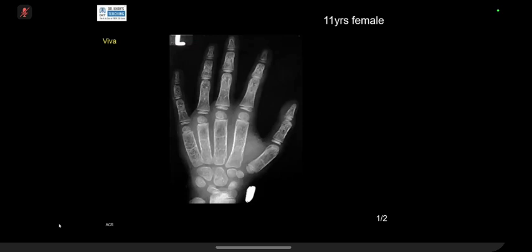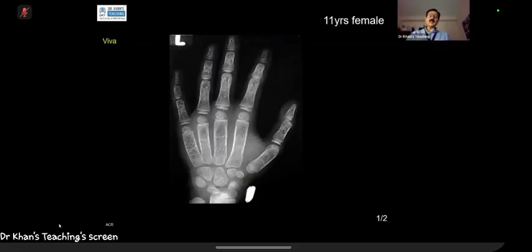So you think that there is usually expansion of bone in hyperparathyroidism? Osteopenia and thinning of the cortex could be there in hyperparathyroidism. So something is happening in the medullary cavities, which is causing this expansion. That is a hint from my side. What comes to your mind?